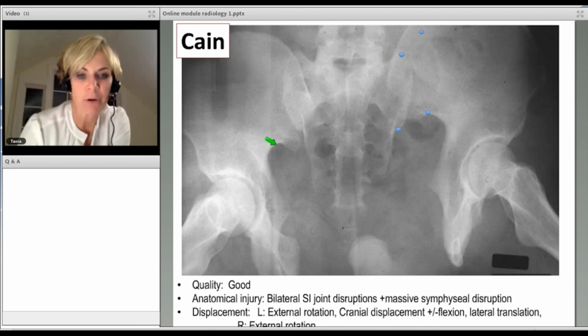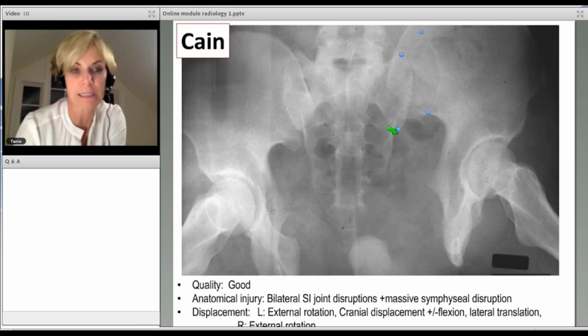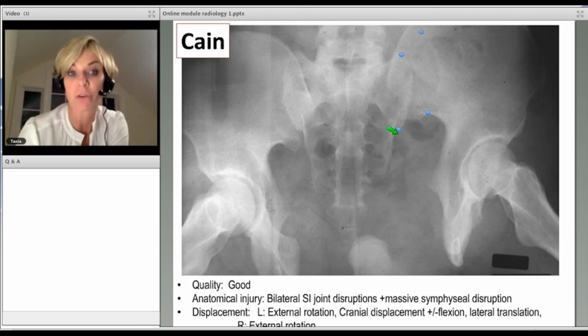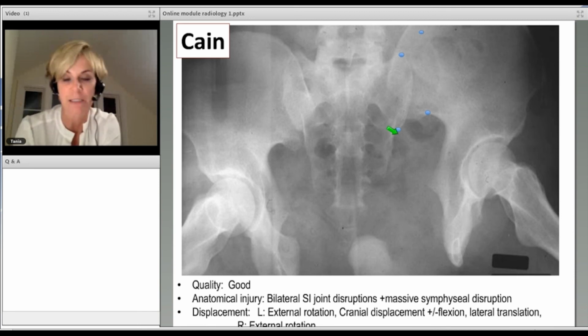And that is supposed to be just caudal to the posterior facet of the inferior portion of the sacrum, which would be here. So this point should be caudal to this. This indicates to me that we also have a cranial deformity. So there's a cranial displacement. It looks like there's a lateral displacement on the patient's left side, an external rotation deformity that's substantial.